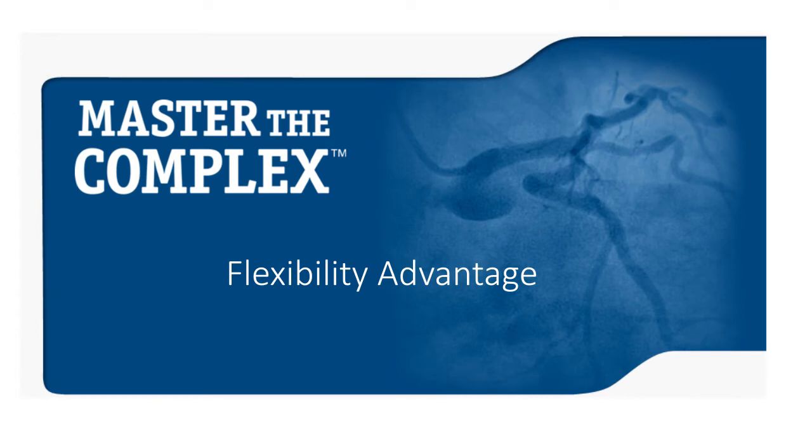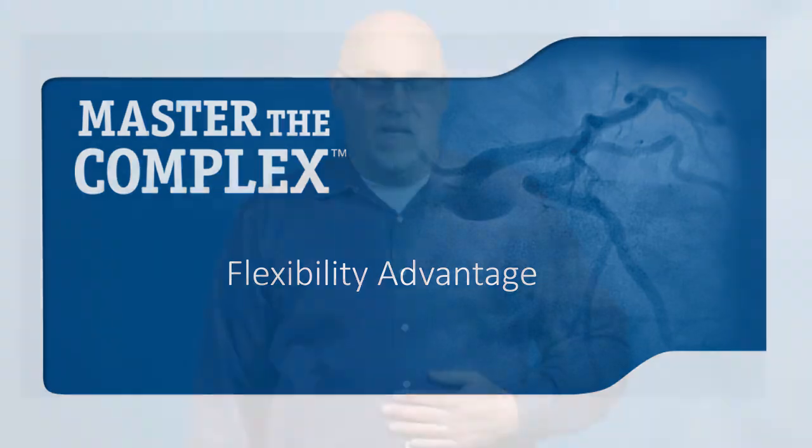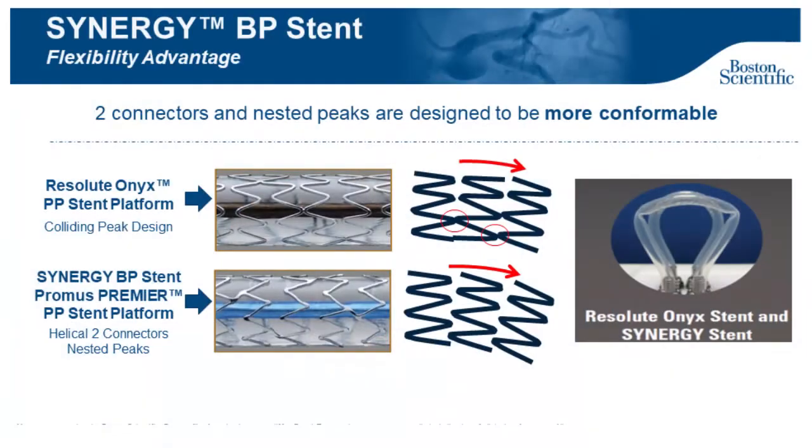Another important feature of stents is flexibility. There are several design elements that make Synergy and Premier more flexible and conformable than most stents. To start with, a two-connector design. And if you just simply think about it, when you have two connectors, it's very easy for the stent to bend. When you have three connectors, right, it makes it much more difficult for a stent to bend. And therefore, two connector designs will most likely always be more flexible than three connector designs.